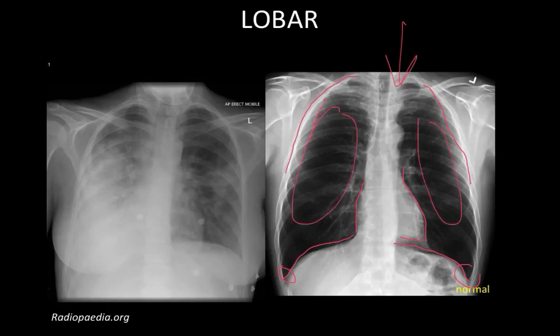Of course, these are margins of the scapula, not to be confused with a shadow of an infiltrate. While this X-ray is abnormal, it's got pleural margins that kind of start becoming hazy around the middle of the chest on the right side. You also notice that on the left side, the pleural margins are distinctly different from what they look like on the right. Also, the heart border that's pretty much sharp in the lower field, in the upper field kind of becomes hazy, close to the aortic knob, underneath the aortic knob, close to the pulmonary vasculature.